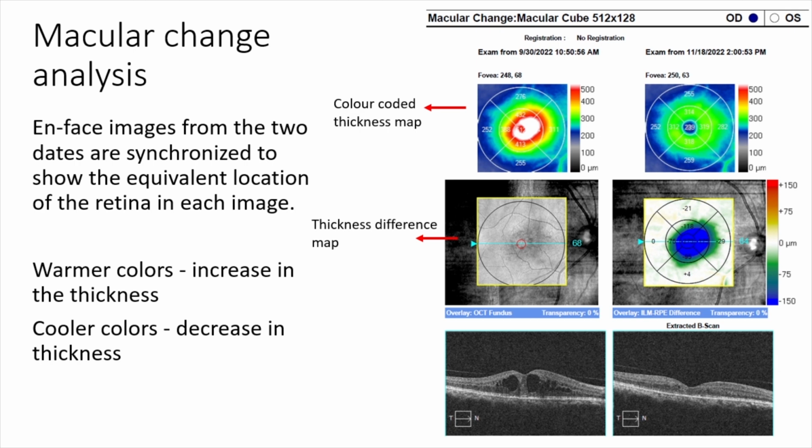If the registration comes successful, I don't see that much. Okay, so if your registration comes perfect, your measurements are accurate. Let us say that your comparison of measurements is accurate. For example, when this shows no registration on the left hand side, that is because both are not the same. If the values are the same, then it comes in green and the registration is successful. Sometimes you have very thick edema, you may get no registration over that particular lesion also.